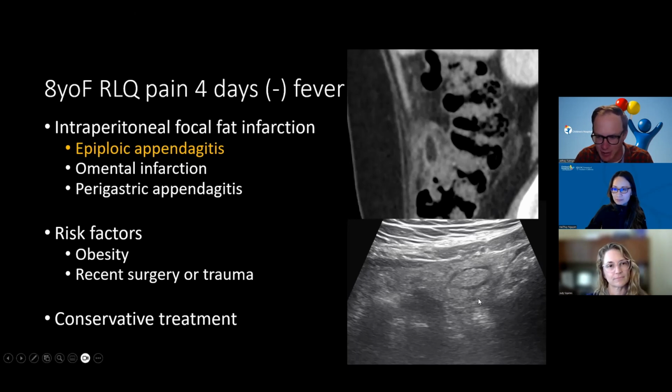I think traditionally they say omental infarcts are more common on the right, and epiploic appendages are more common on the left. But I kind of agree with you. With how rounded this looks, it looks more like an epiploic appendage. One of our audience members commented, are there epiploic appendages on the right side? I'm not sure. I assume they were along the entirety of the colon, but classically they say it's more often on the left. But I agree, this one to me looks like one.